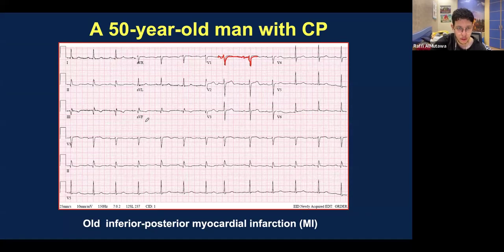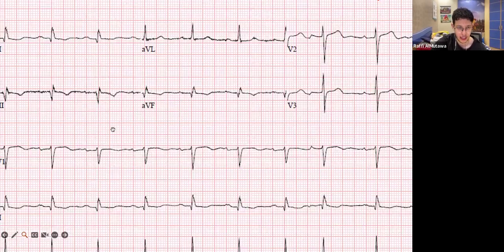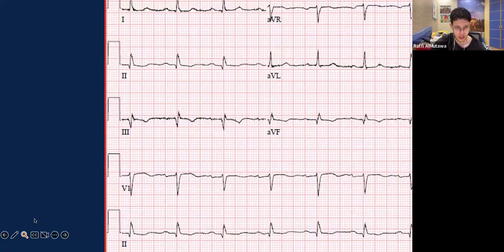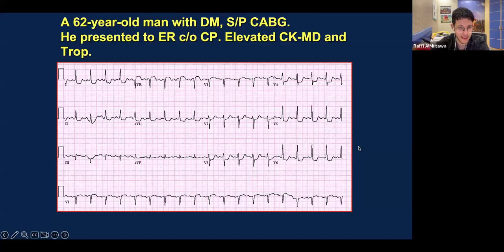No, even in aVF, the Q wave doesn't look that deep. But again, keep in mind, it's not an acute STEMI. With an acute STEMI, you do need 2 leads. With an old one, there's certain criteria. But if you see one deep Q wave, that is a sign that this is an old STEMI. They don't really ask old STEMI questions because it's not that much. But because it was part of your lectures, I am including it. That's the only reason why I left it.